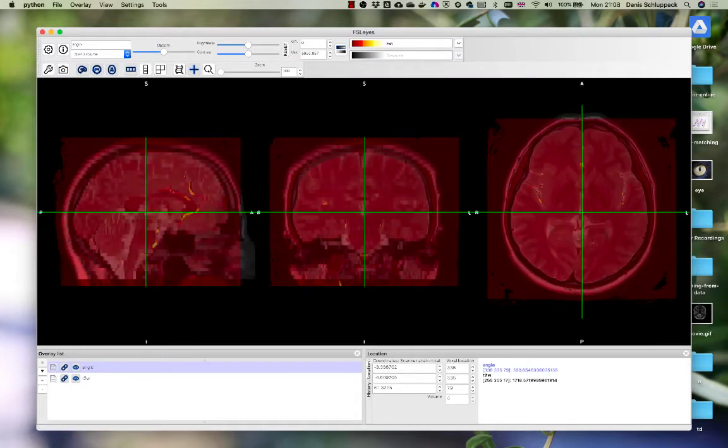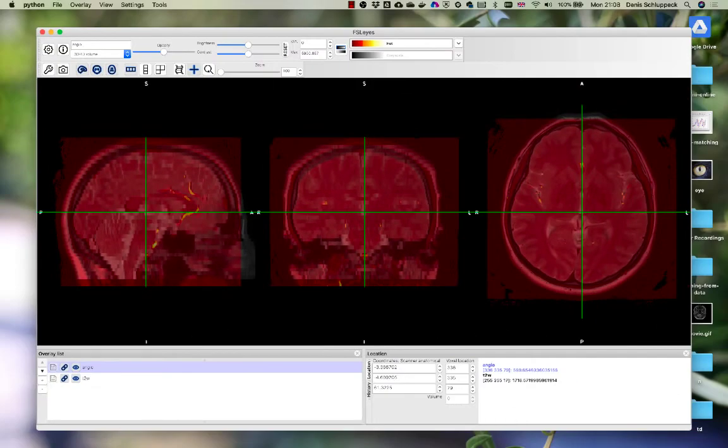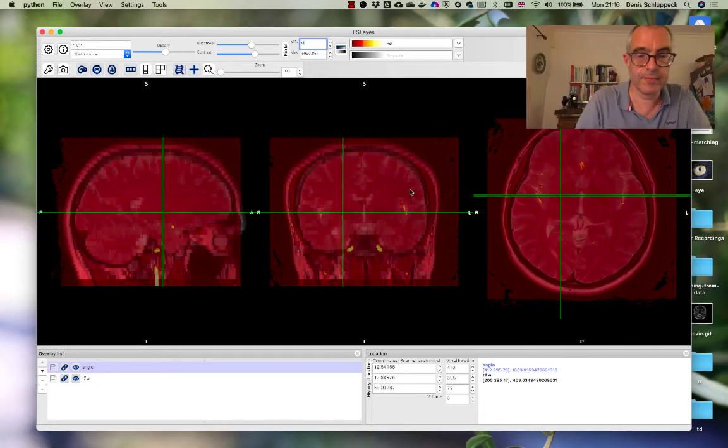If you look down here in the bottom left, you can see there's 2 layers. One of them T2 weighted, which is underneath, and the angio on top. They have slightly different dimensions, but they display. With the angio one selected, you can see that the opacity value is at 50%. So if I can yank that up and go down. So if we now start manipulating the range of values that are actually being displayed, right?